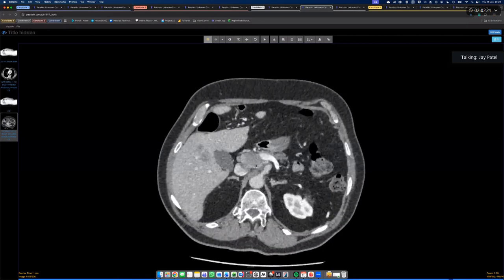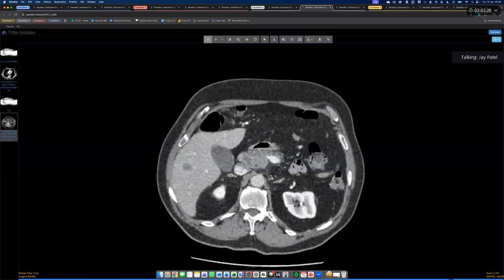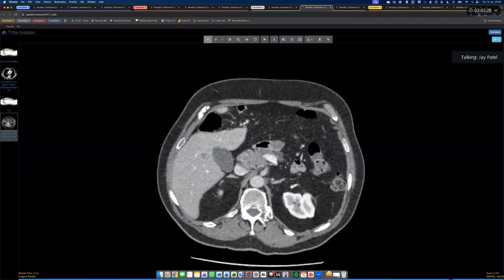And it's not because I showed you a tiny pancreatic cancer just a little while ago, didn't I? And it caused a lot of mass effect. I told you on that first pancreatic case that pancreatic tumors typically cause a lot of adjacent mass effect. They crush vessels, they cause ductal dilatation. They're quite a massive, hard tumor.